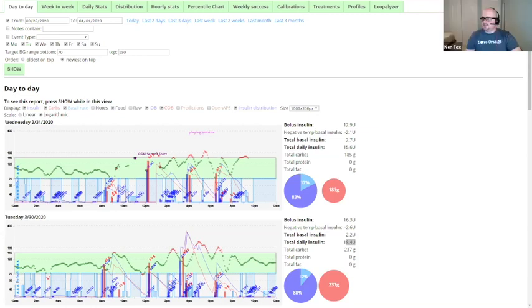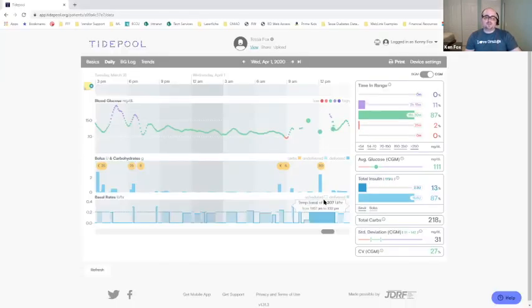It's just see what time basal was delivered and how much. Okay, so if you want to see a particular moment in time, you should be able to hover over this bottom section of Tidepool, and it should tell you what the rate was. I don't know if it'll tell you exactly how much was delivered. If you want to see how much was delivered in a certain block of temp basal, you'd have to go into Apple Health and go back to that time and look at how much insulin Loop logged, because it logs insulin every time it changes the basal rate.